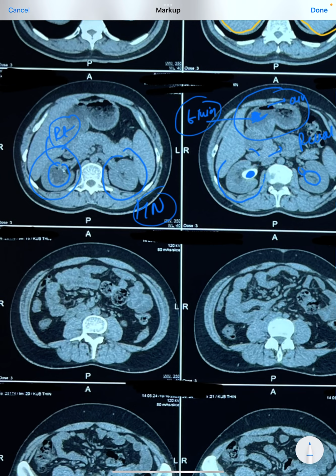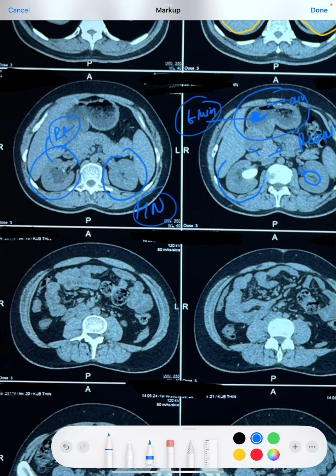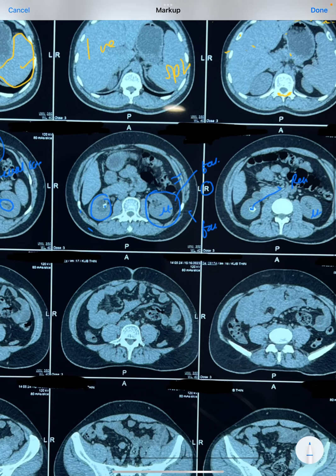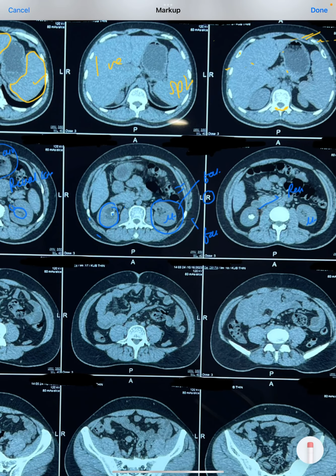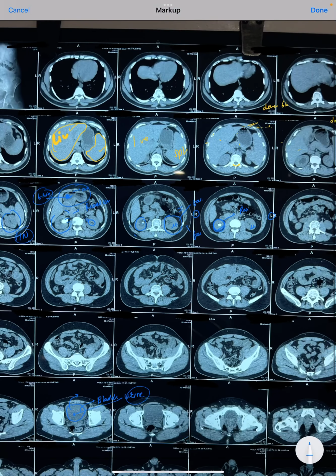That is called hydronephrosis. We call it hydroureter if this is seen in the ureter. But here the urine is only visible in the kidney. It is not visible outside the kidney. If it is visualized outside the kidney, we can label it as hydroureter, but there is not much prominent hydroureter. It is all in the kidney itself, because in here there is not much accumulation of urine in this side. So this is all accumulation of urine into the kidney only, and not in the ureter. So this is kind of hydronephrosis with almost no hydroureter.